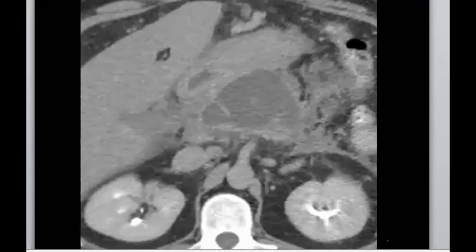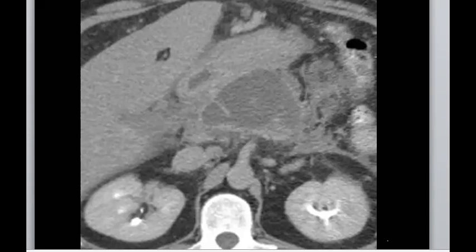Yes, much cases. Try to find your landmarks. I know that it's a selected image, but you can try to, yeah. Mucinous. Where is this? No. Mucinous cyst. Mucinous, but you mean that it could be pancreas, right? Yes. So let's agree that it's pancreas, then we can see what it is. So yeah, I agree with you that it's pancreas.